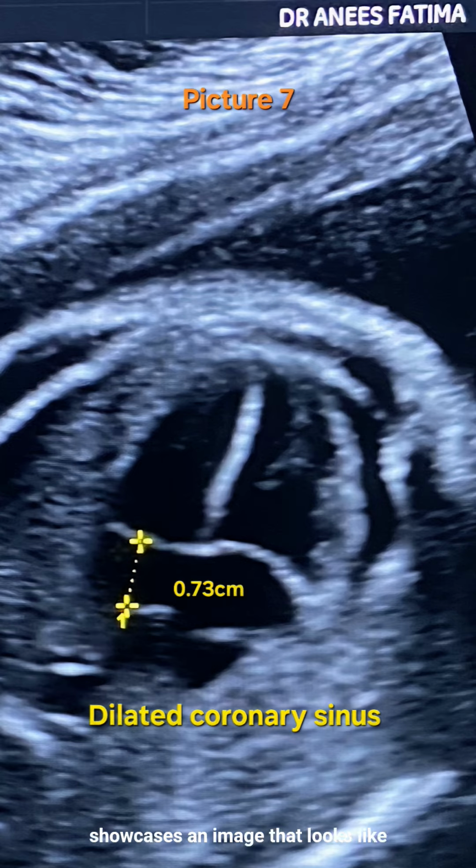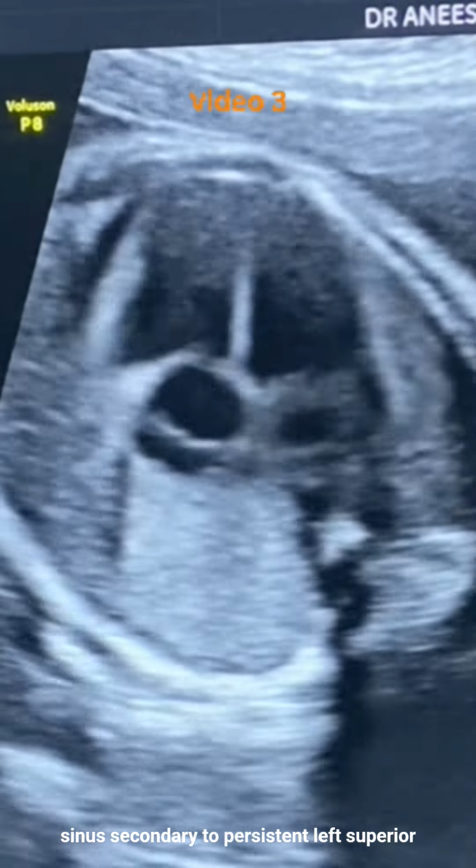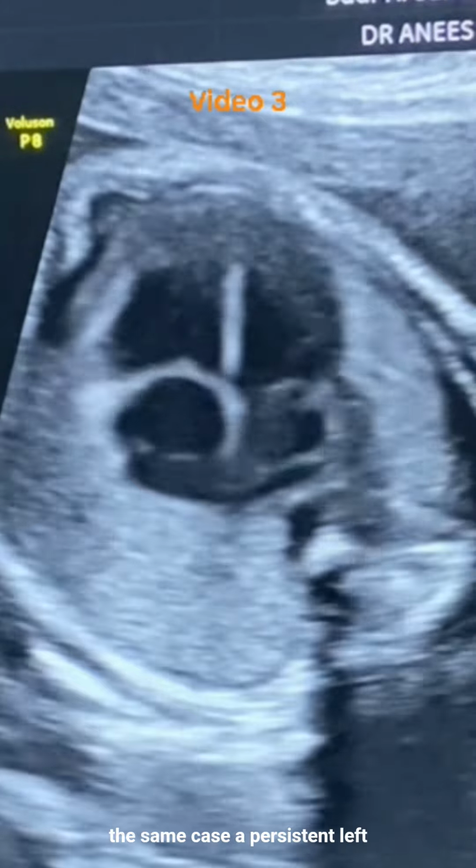Picture 7 showcases an image that looks like the offset appearance is lost. However, this is not a case of AVSD. It is a dilated coronary sinus secondary to persistent left superior vena cava. Video 3 is also of the same case.